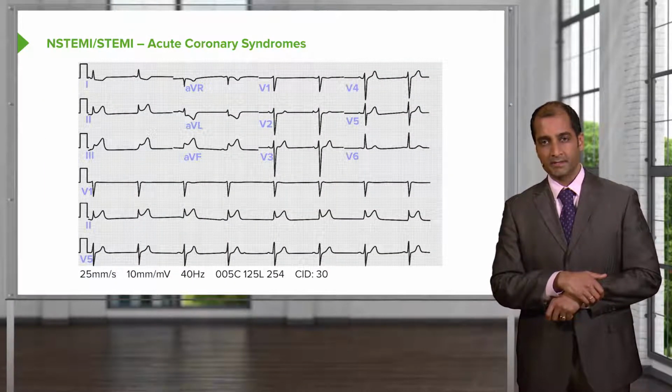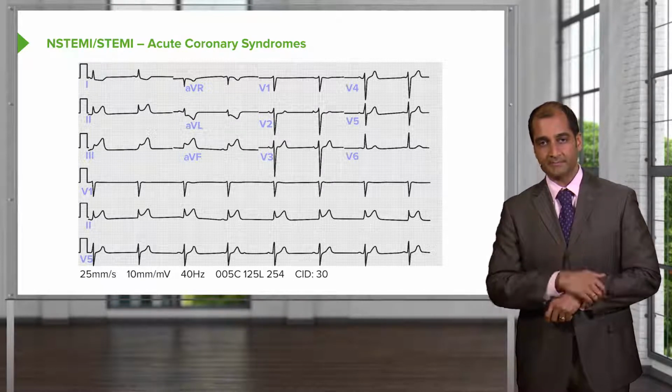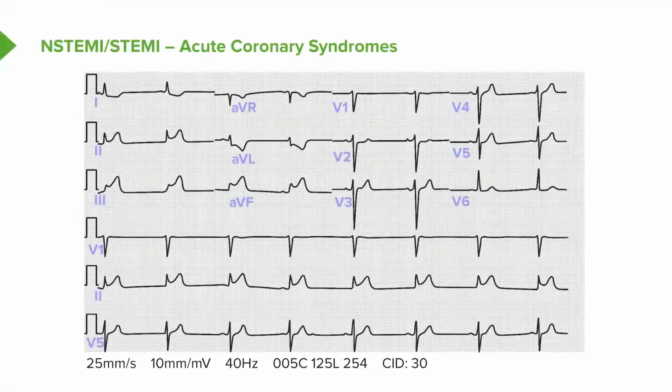Now here, what we're looking at is exactly that. Take a look at lead 2. At the second to the bottom, you have lead 2, you have an ST elevation. And for the most part, you see something like that, and then you should be thinking, well, is my patient having an inferior type of MI? And if you take a look at the AVF, you'll notice there as well, you call it a fireman's hat.